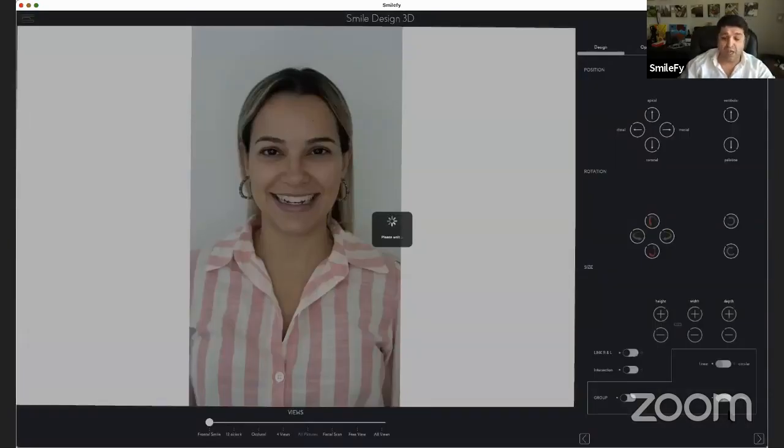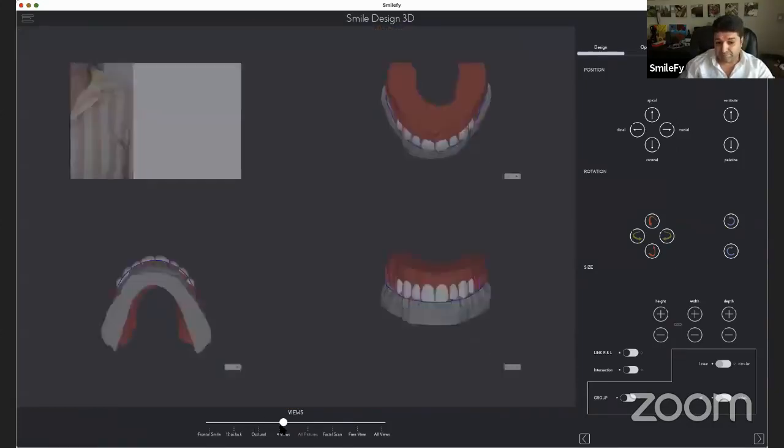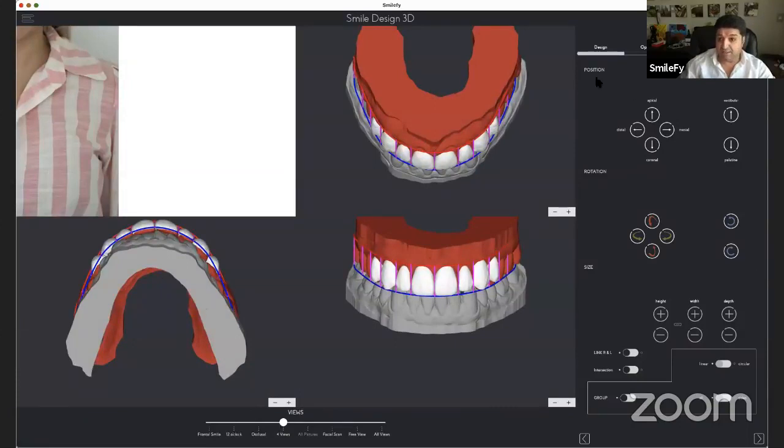And it's going to change the way we design uppers and lowers, because as a preview, what I can tell you is the position of the teeth and the dimension of the teeth is not random. So we don't need to move every single tooth one by one to place it in the correct position, because we can calculate the relationship between the position of the teeth. We can calculate with the smile frame, and we can place uppers, lowers based on patient situation and your adjustment, right? And your adjustment.